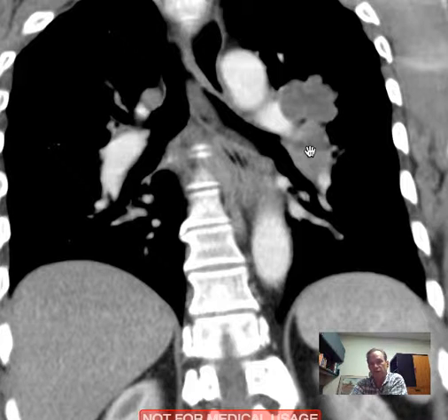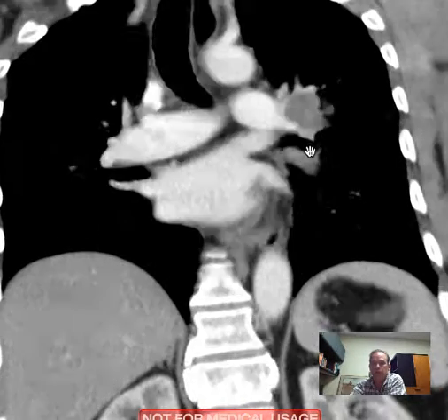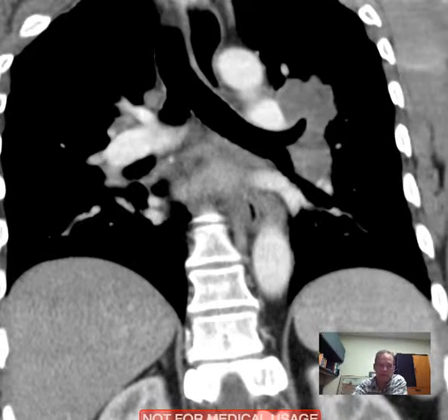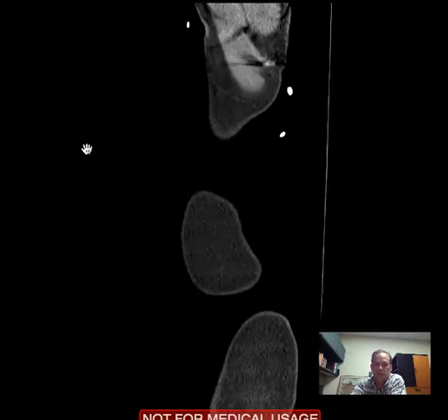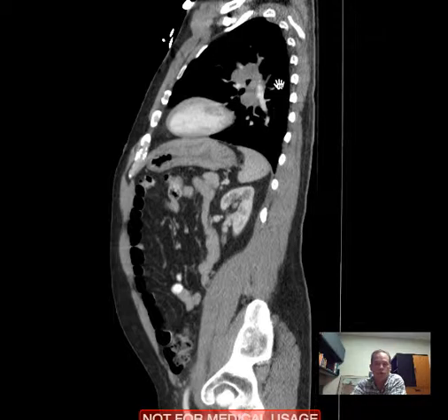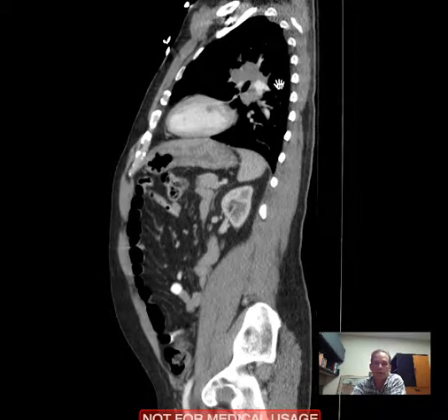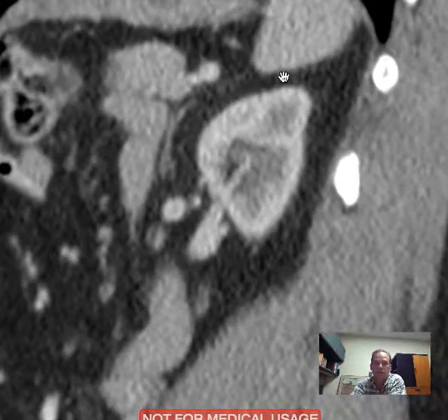And you have to think of a number of differentials. Learning Radiology, the book, as well as the podcast or online, will give you a nice brief differential of those, and I encourage you to look at that closely. Let's take a last peek here at the coronal or sagittal images. So here we are coming on the sagittal images.